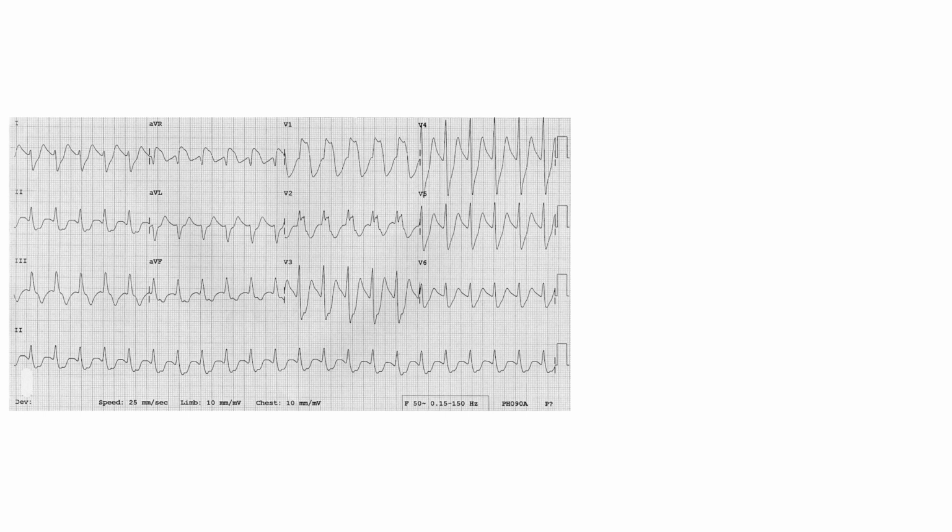Then you have here a really wide complex tachycardia, and the frequency around it is maybe 120 only, but I've seen them up to 130, 140 sometimes, but they're not like these VT 180, 200. They're usually normal frequency or up to 130, 140, 150, and it's really wide.